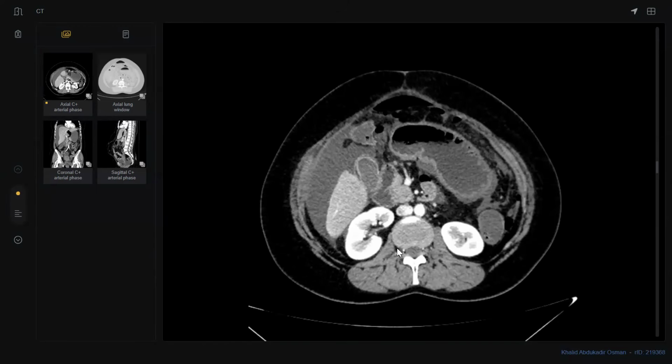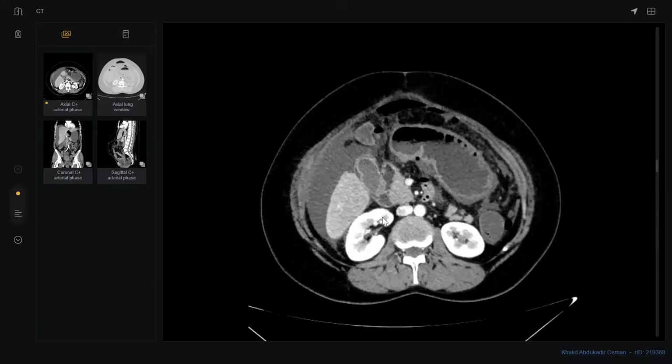This is an emergency finding. I would call the referral, and this patient needs an urgent surgical review. I will also have a further look at the lower chest as well as the bone scans just to complete my study. This patient will need an urgent surgical opinion and surgical management as well, which is likely going to be a surgical laparotomy. Okay. Thank you, doctor, so much.